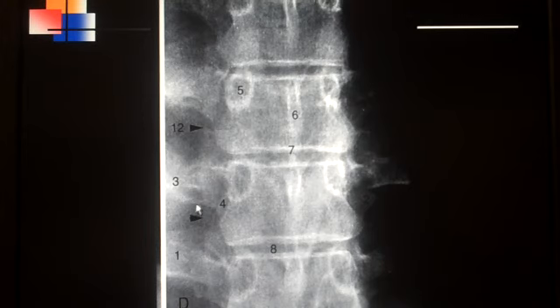line. And basically this is inside the lung field and this is outside the lung field. And so that's why this area is just a little bit darker in density, because the air in the lung has no density. This concludes this video.